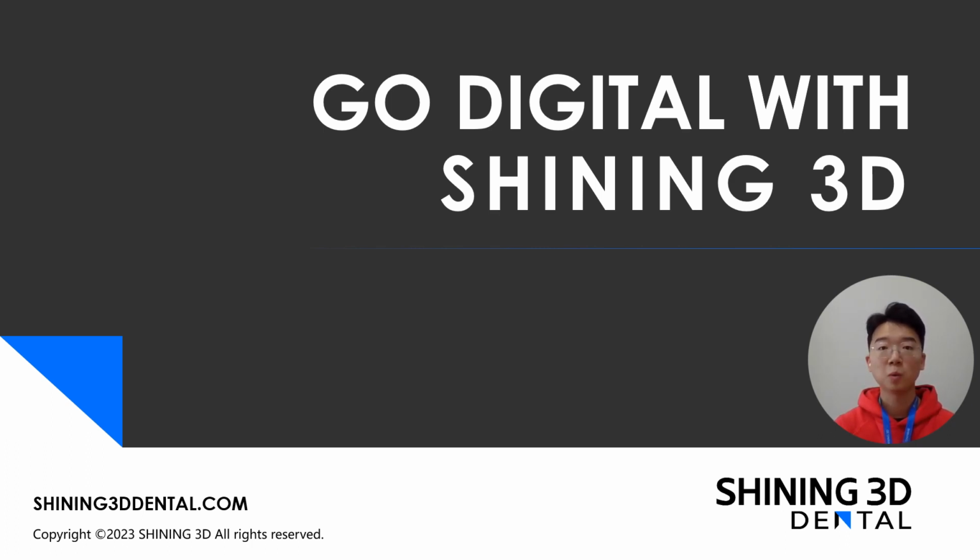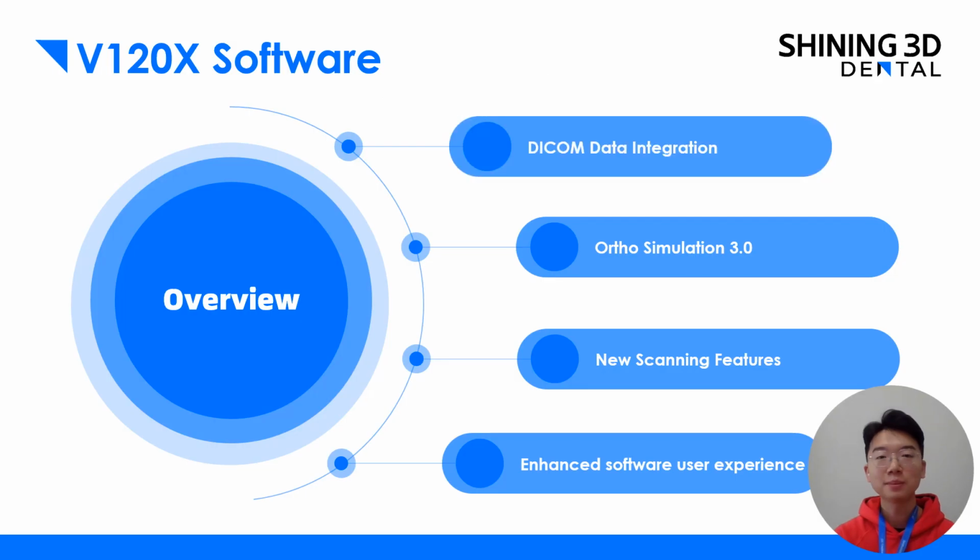In today's webinar, we will go through the update content for the face scanner software V120X. The update content for V120X software is mainly divided into these four parts.